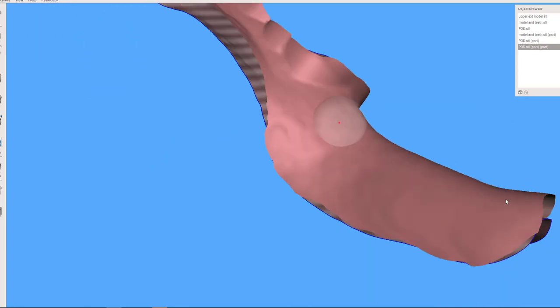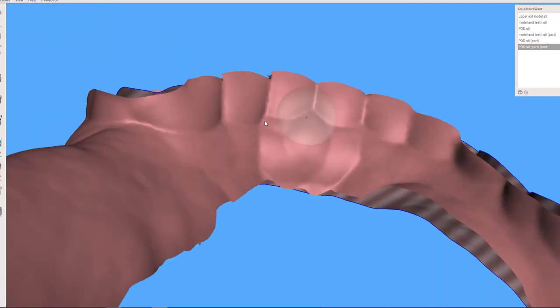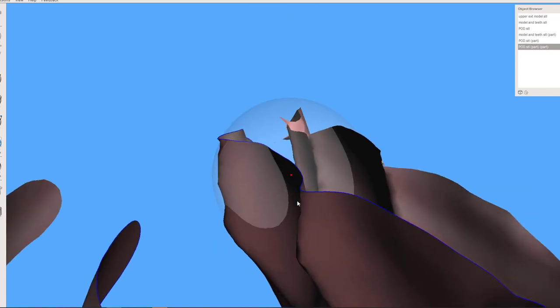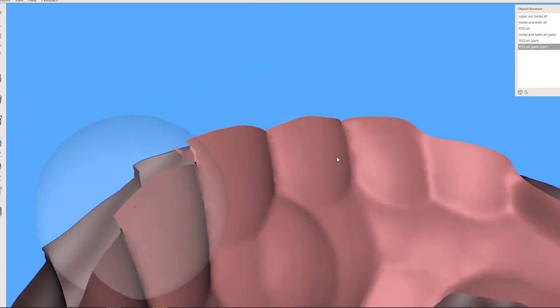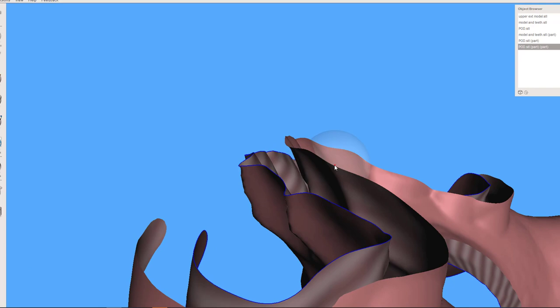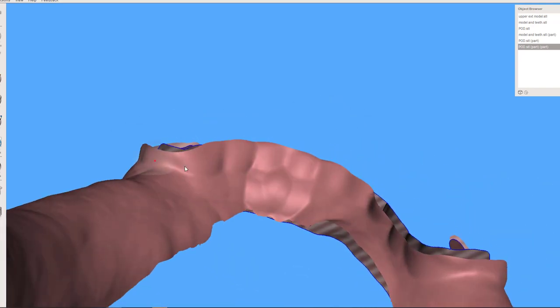So smoothing those up, I'm going to go along most of the edges here, because one of the things you will see is by virtue of offsetting, it gets taller outward in every direction, and we don't necessarily want that. We want a flat contour across. So using the shrink smooth tool can bring some of that back down to where it's not so high. If later on it needs to, we'll just cut that down manually. Okay. I'm going to go through here.